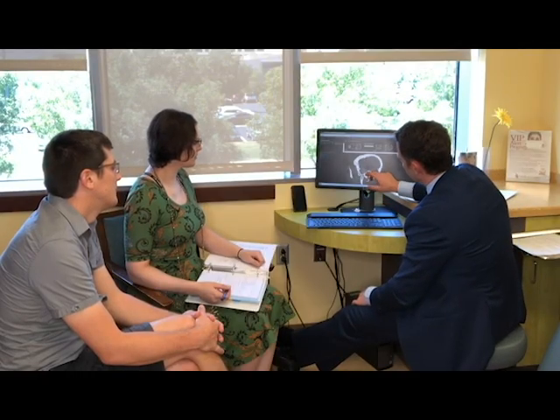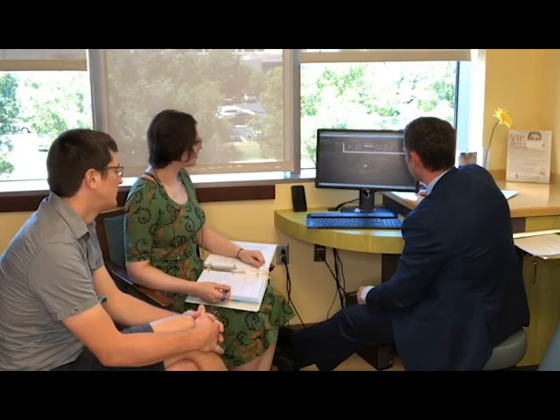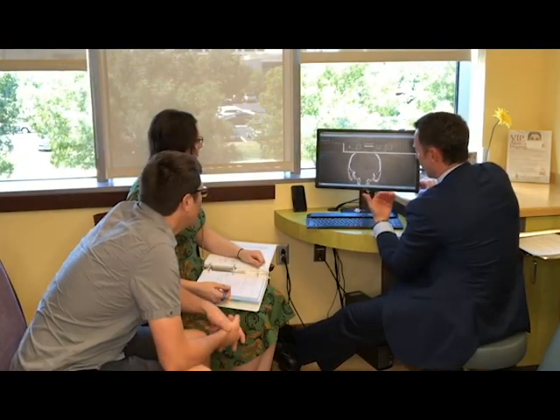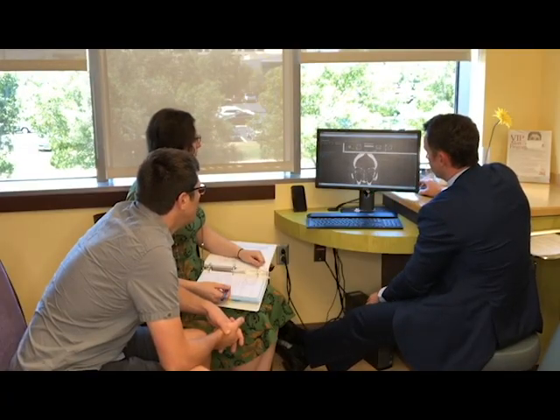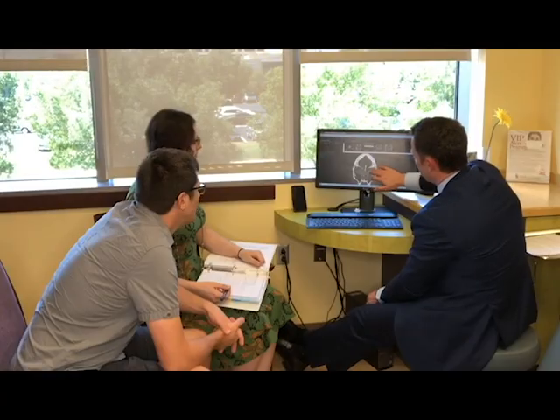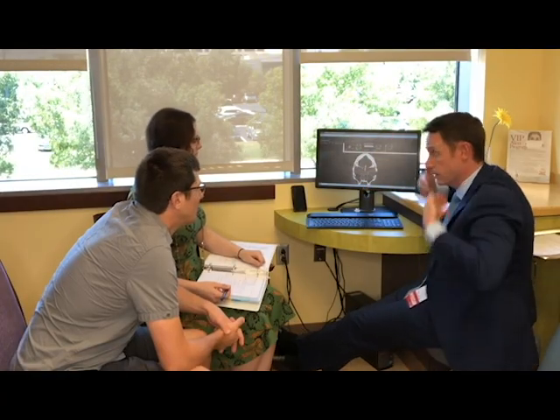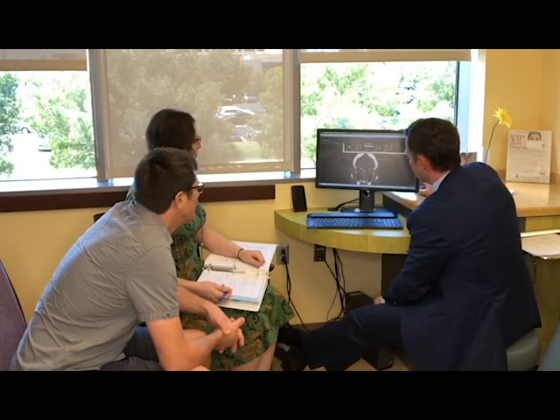And I'm going to show you one other view of that, which brings up another anatomical point. This is you looking straight out of the screen here. Left eye, right eye, top of the head. So now the cut is like this. Okay, we call it coronal view. You're looking right out of the screen here. Again, we're going to go backwards here.